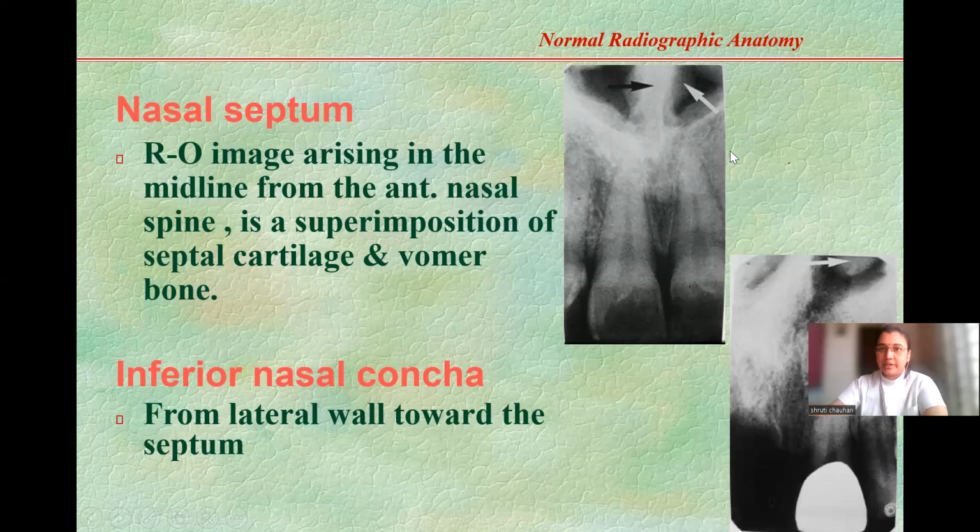That is how you describe the radiolucency. Okay. Now we will go to the next slide.